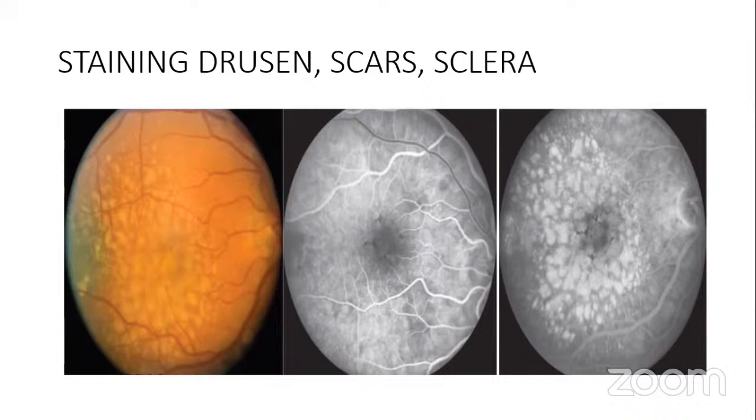Okay, so a microaneurysm is a vascular dilatation. A dot hemorrhage is a leak, a bleed. A microaneurysm would be hyperfluorescent. As the dye passes through the vessel, the area will give you a dot pattern in the area of the microaneurysm. But in a dot hemorrhage, the hemorrhage will rather block your background hyperfluorescence, depending on how large the hemorrhage is.